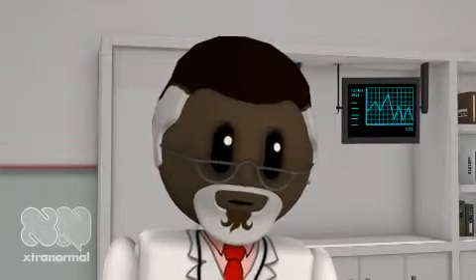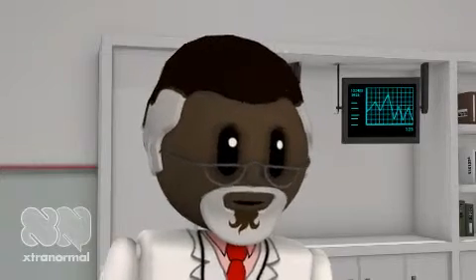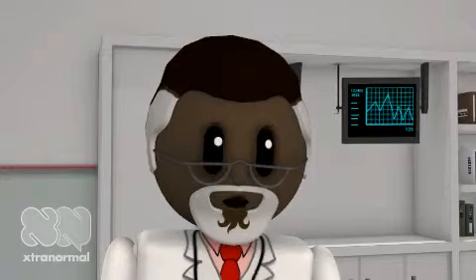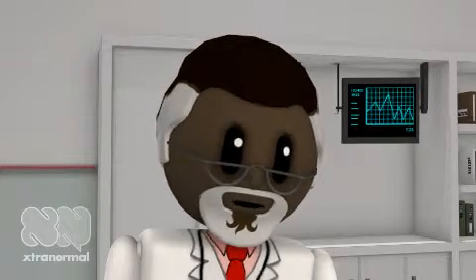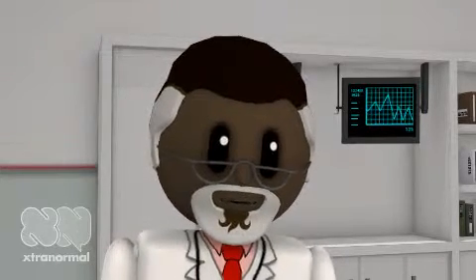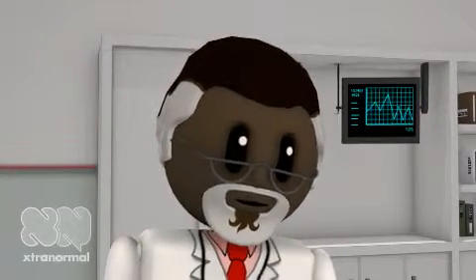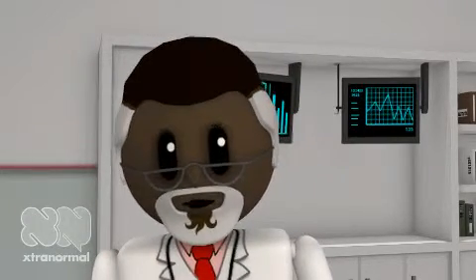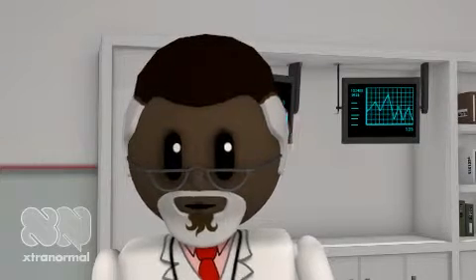Pressure support ventilation (PSV). This mode augments a spontaneous breath by applying a preselected pressure to deliver a higher volume at a lower patient effort. Flow time waveform is used to recognize a pressure-supported breath. Pressure time tracing indicates a patient-triggered breath. Volume time shows delivered volume which depends on the pressure support level.